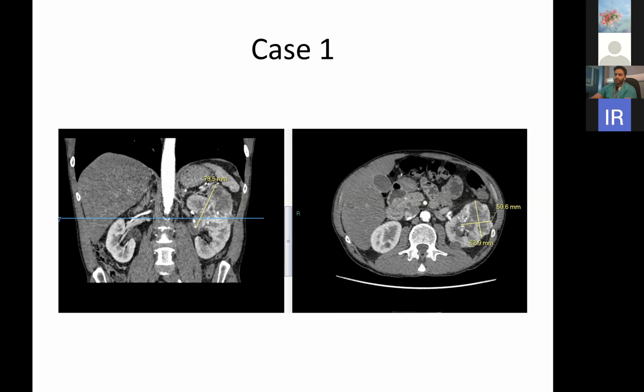It's certainly not homogeneous. I'd also look at the surrounding structures, obviously the adjacent fat, and any additional free fluid in the abdomen or in the upper quadrant here. See if this is involving the spleen, and the adrenal glands, particularly on the left-hand side, and then look at vascular involvement.